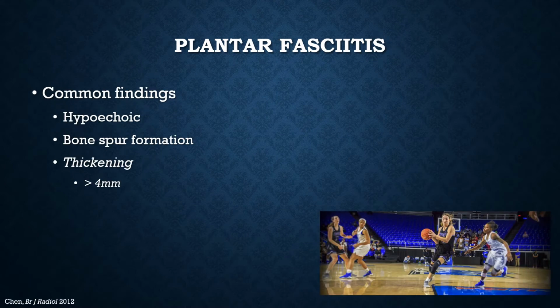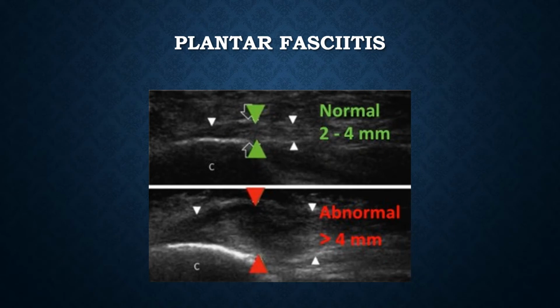These are some of the common findings on ultrasound in patients with plantar fasciitis. It's been reported that the thickness of the plantar fascia is more clinically indicative of pathology, especially when the thickness is measured to be greater than 4 millimeters. Even though a thickness of 4 millimeters or more is widely accepted as pathological in the literature, remember that there are exceptions to this on both sides of the spectrum.